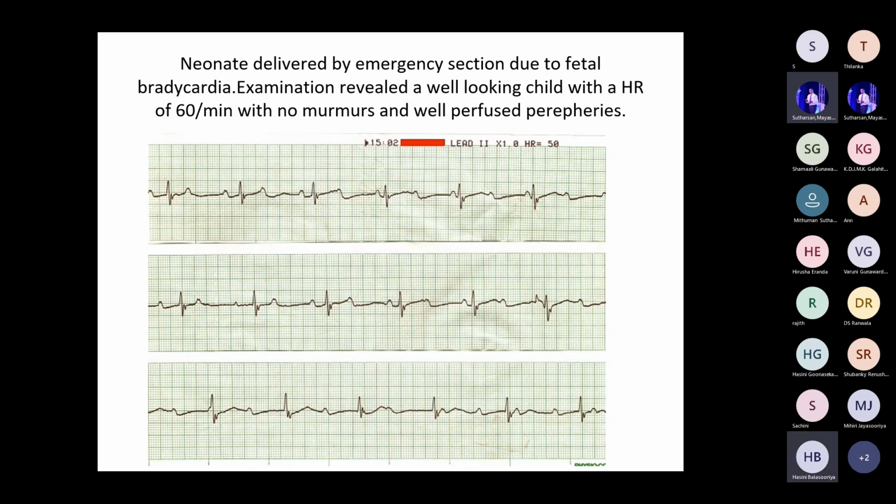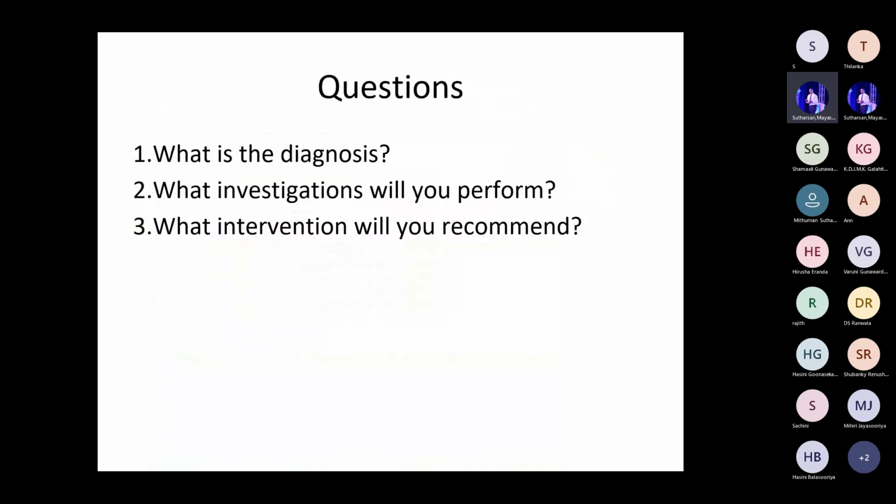Neonatal lupus. No, no, ECG diagnosis. So what investigation... Actually, neonatal lupus is not the only reason, it's one of the reasons for complete heart block, right? One thing, the rates are low.